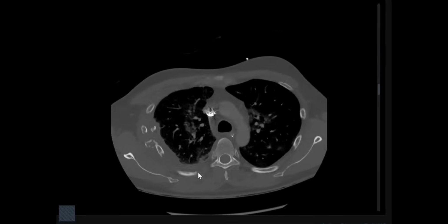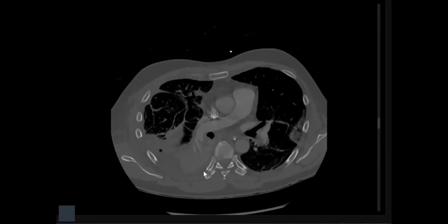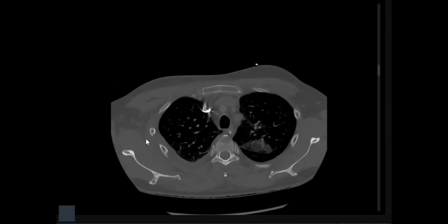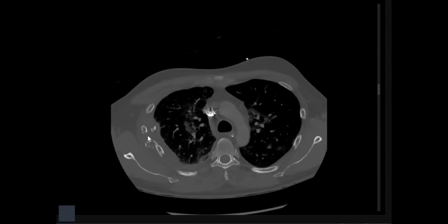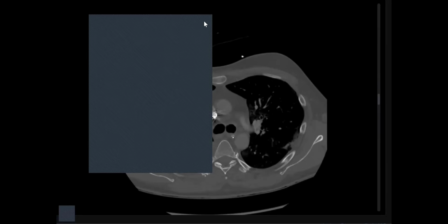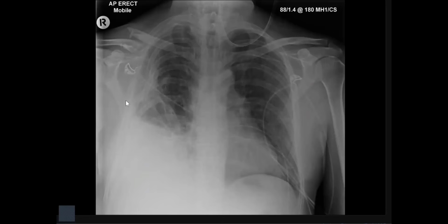Fracture, fracture, fracture. You see multiple posterior rib fractures associated, in the same ribs, with multiple lateral rib fractures. The diagnosis will be flail chest. Yes, it's an emergency. Unfortunately, it's missed on the first look. What happened later on? A flail segment is formed, and of course, some collapse of the lung.